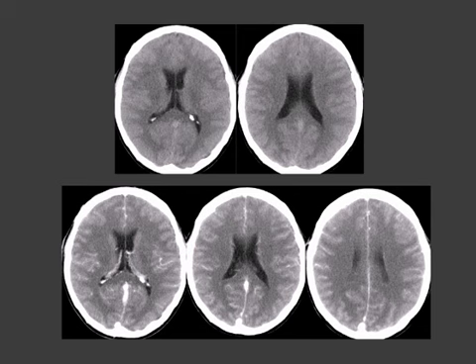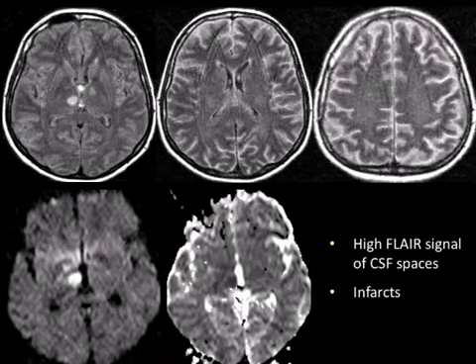The only thing that maybe you should think of is why are you not seeing at least one sulci? You should see subarachnoid spaces, even if a patient is very young. Then you give contrast agent, and now we can discuss for 30 minutes, is this leptomeningeal enhancement or not? If you have a very early meningitis or viral meningitis, you will not see a lot of enhancement. So don't expect enhancement as a sign of meningitis. Look for indirect signs. An indirect sign is non-existent or not visible subarachnoid spaces.